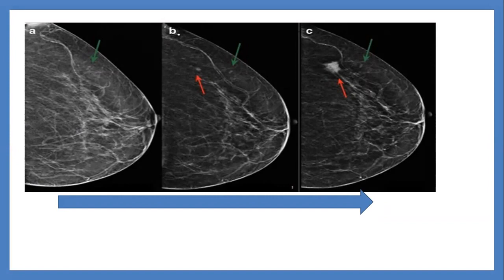I can't appreciate the fatty hilum in it. It's so small. But there is a blood vessel near it. Excellent. There is tiny central lucency. It's okay. So suspected. Suspected to be? It's suspected to be an intramammary lymph node. Excellent.